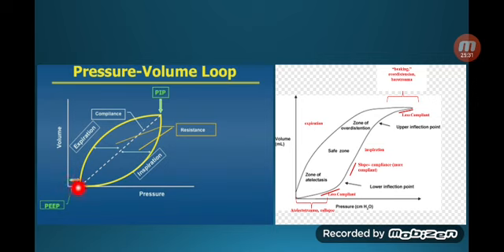So the amount of pressure that we're beginning at, that is away from the 0 bit, is the peep, basically. So let's say this is pressure 0 and this is pressure, let's say 5. So we've got a peep of 5 or peep of 8 or whatever.